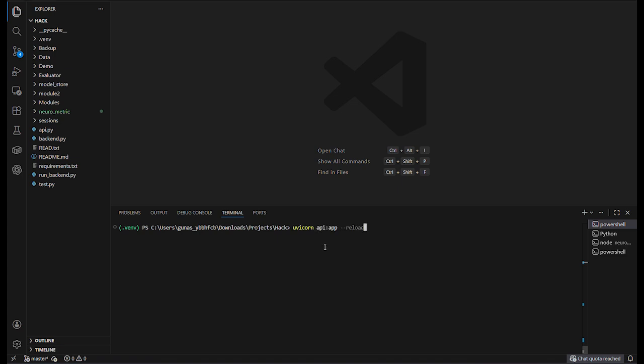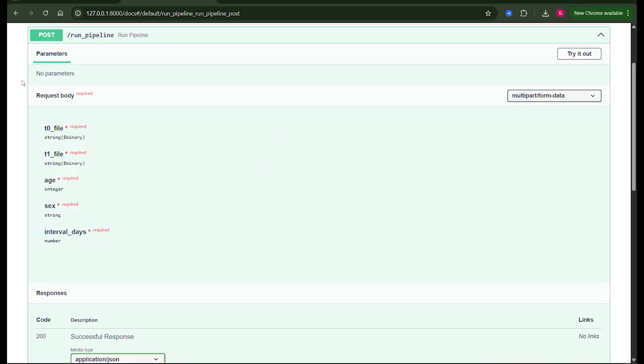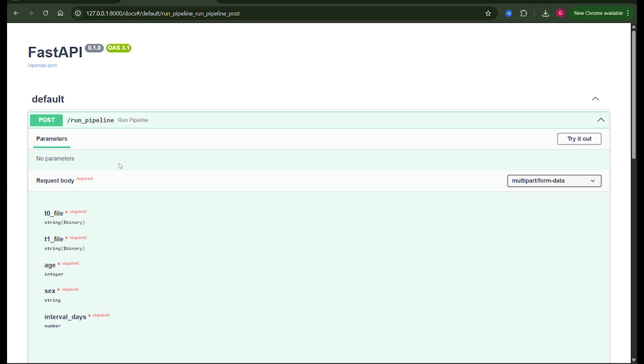In this video, I will explain how to use this and run. Initially, we have to start with the API. Then, once it has been loaded, we can just move to the API server UI. Here, we should select what are the required MRI images to be passed.